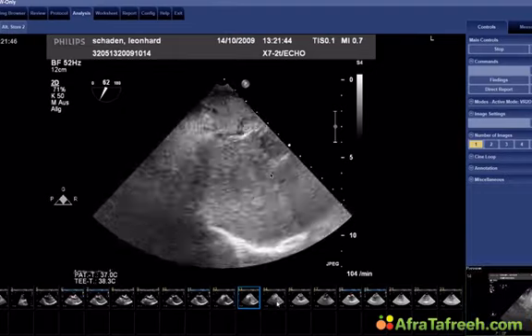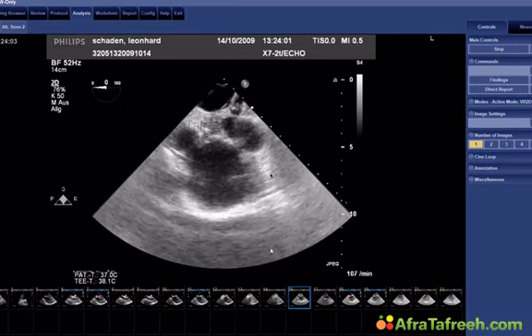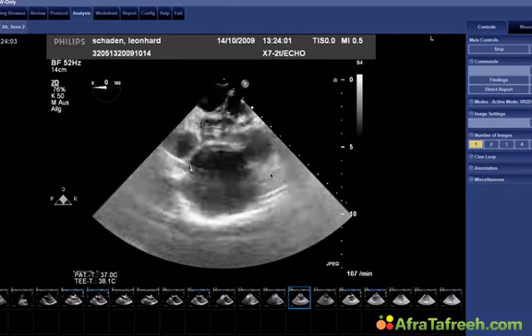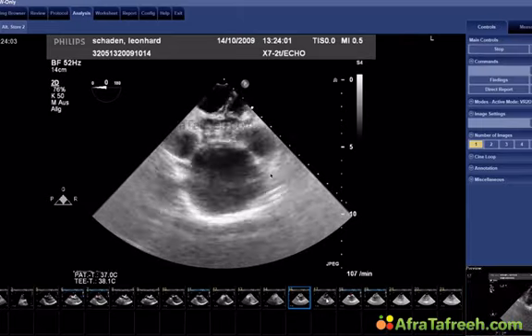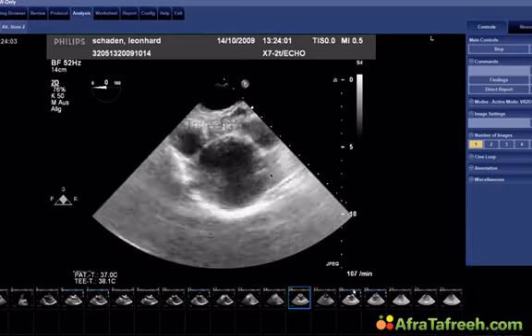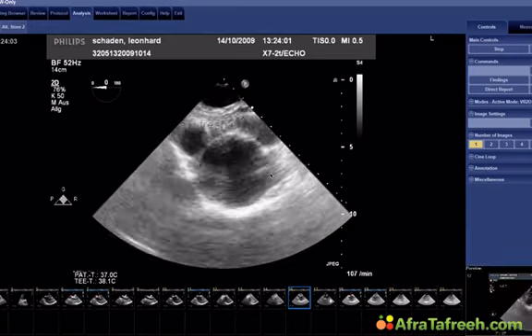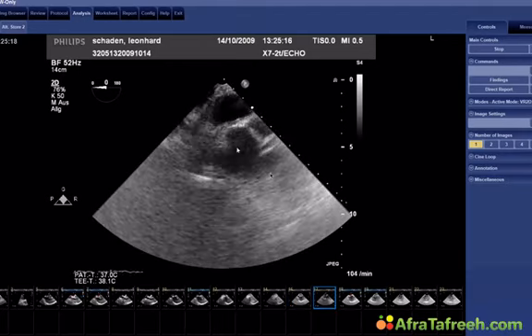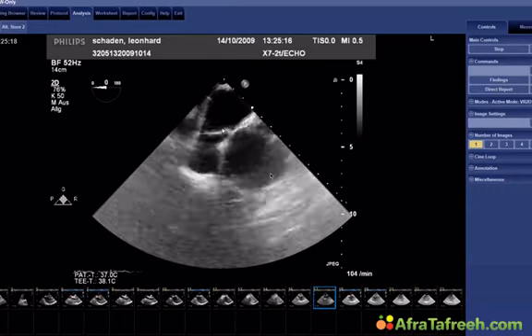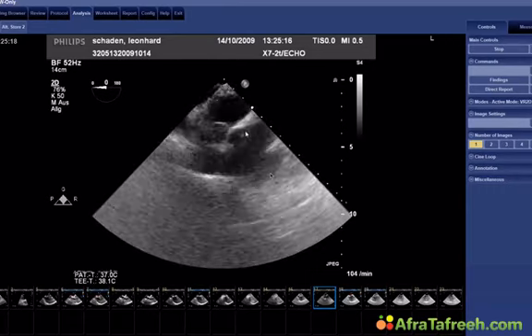Now, how is that explainable? How can we explain this? Well, now we'll go back again to the aneurysm of the aorta. This is the reason why the shunt is so large. It's simply that this aneurysm of the aorta is distorting the interatrial septum. Here you can see this very nicely. This is the aorta, and here's the close proximity to the interatrial septum.